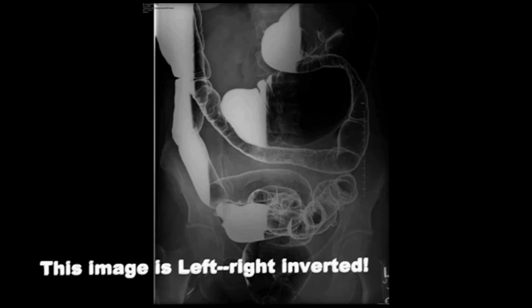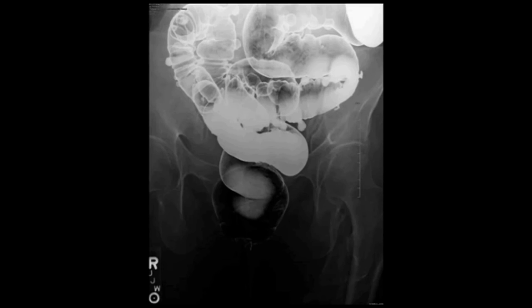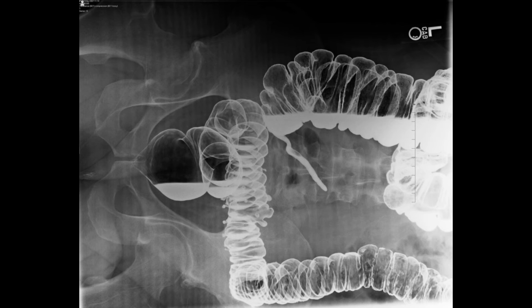Here is a barium enema which I requested to be performed on my patient because I was unable to complete the colonoscopic exam. This colon was too redundant and too tortuous for me to pass the colonoscope safely to the cecum. You'll soon see why. Notice the cecum, which I've labeled, and the transverse colon are quite redundant, especially the transverse colon, which dips down below the cecum. There is loss of haustral markings because the colon had been distended with air during the colonoscopic exam, and because of the redundancy of the colon, I was unable to cannulate the cecum with the colonoscope.